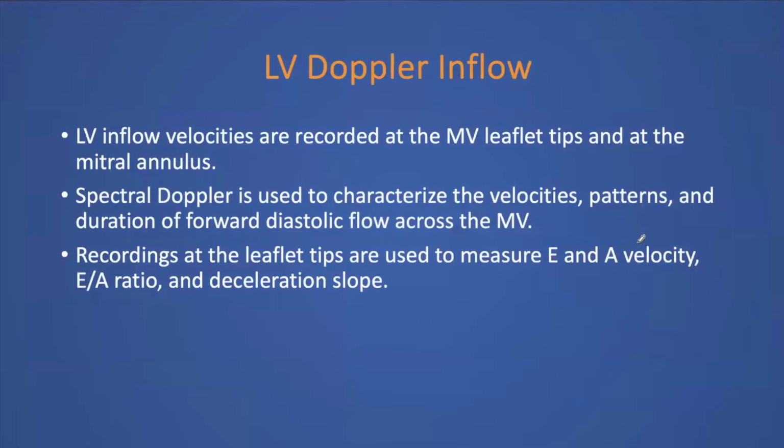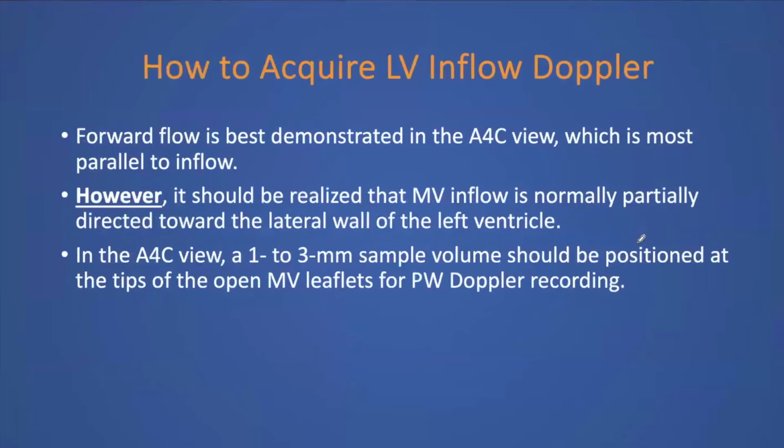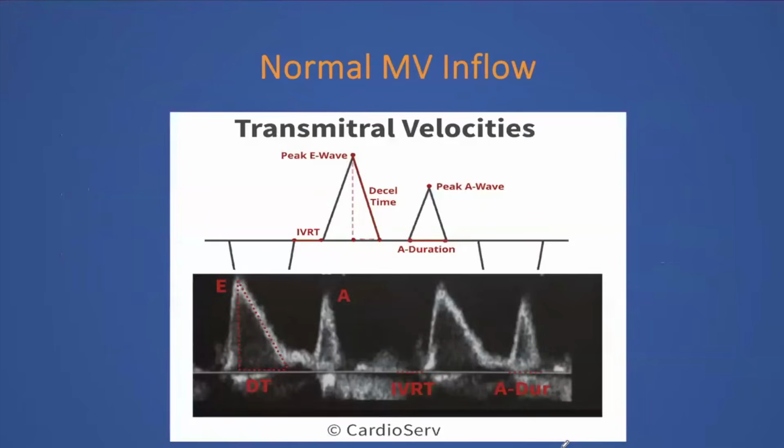So how about the mitral inflow, the Doppler? All of you are doing a great job, and it's just to note a few things. Where should we pulse? Always at the tip of the mitral valve leaflet, and they say usually the flow goes more toward the lateral, not central or toward the aorta. This is the normal flow. If the heart is like that, I'm bad at drawing, and this is the heart. The flow is normally going like that in the heart and going out. This is the normal flow of the heart.